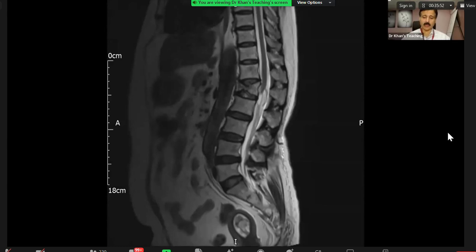No, just give me your diagnosis on the other two findings. Oh, the other things. Okay. So the cord lesion is high T1, quite homogeneous signal. Can I give you a hint? It's an incidental finding in the cord. So yeah, I thought it was a lipoma, essentially. Lipoma, here you are. Okay, I'll take over.